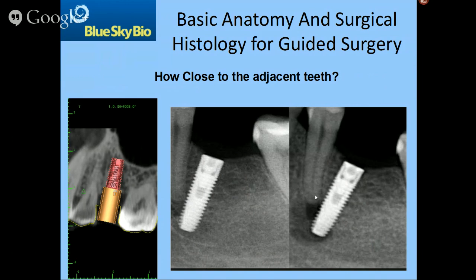If the patient's lucky, that's all they'll need. But that's what happened. This is not an infection from the implant placement. This is a devitalization of a tooth because the bone was encroached upon and there's no longer a blood supply here. So of course there was some bleeding over here and some trauma just from placing the implant, and the bone could not recover in this area, leading to the devitalization of this nerve. The nerve died back, and it wasn't a good day.